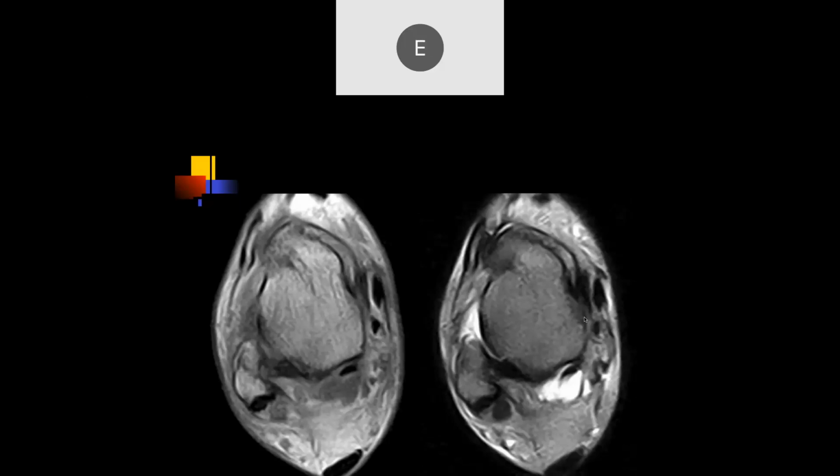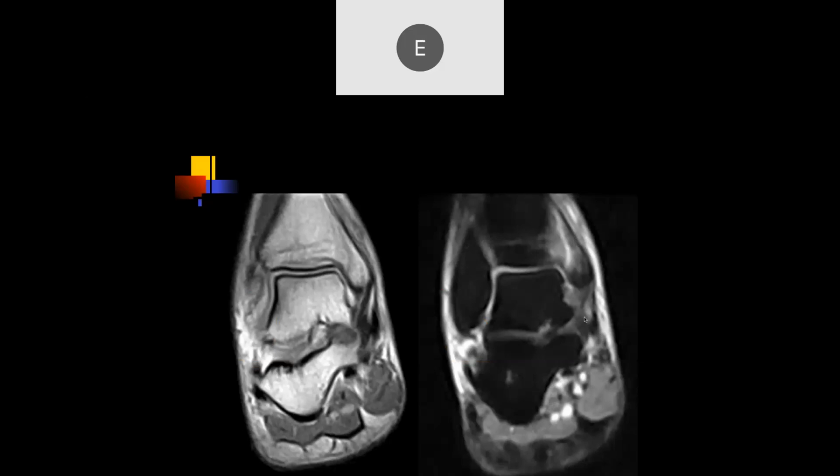Okay, so looking in the area of the anterior talofibular ligament, not seeing it well and concerned for a tear. Let's see, I think we're looking at the... Hmm. I'm not sure. Are we looking at the deltoid ligament here or? Okay, so this has an oblique fracture of the medial malleolus.